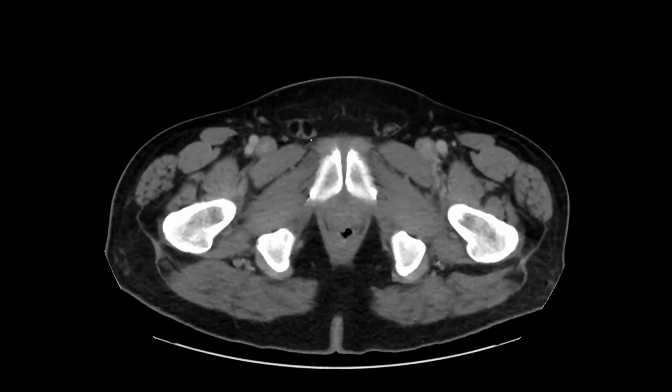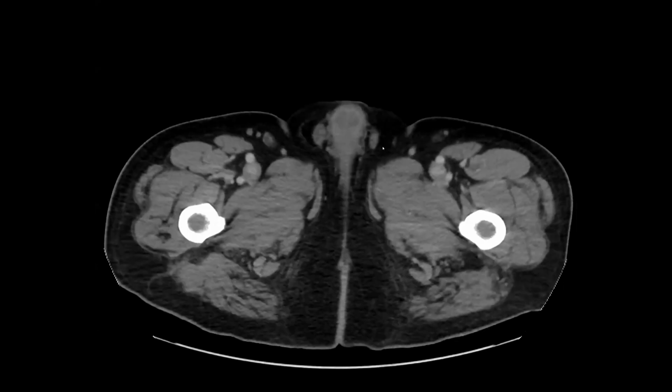Cool. Was the spermatic cord missing in that one too? Let's see. I don't think so. No. Oh no, never mind.